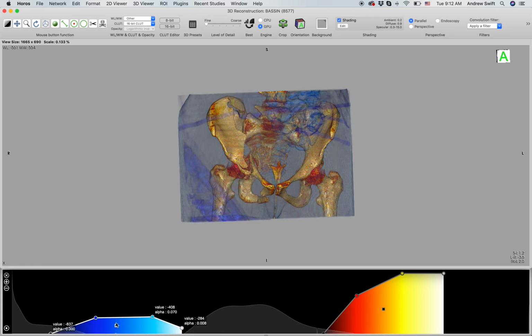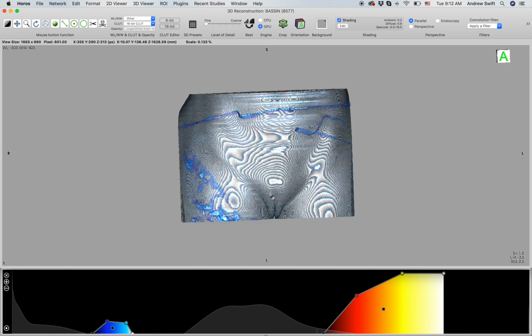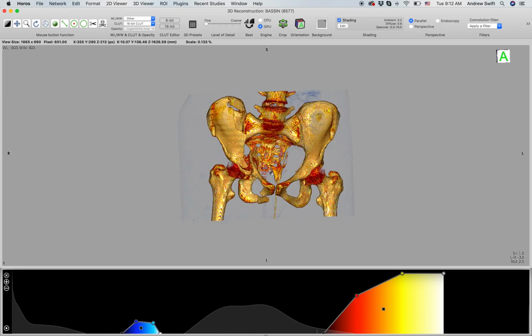Now we can use this. We can raise it up or lower it, and it kind of creates a depth of field. It creates some environment for us. Lowering the value will lower its opacity as it's applied to the color lookup table. The key commands are: Option-click-drag to the left will compress a curve. Option-click-dragging directly up and down will move that curve along your data. It doesn't always update perfectly, but as soon as you let go, you'll get it.